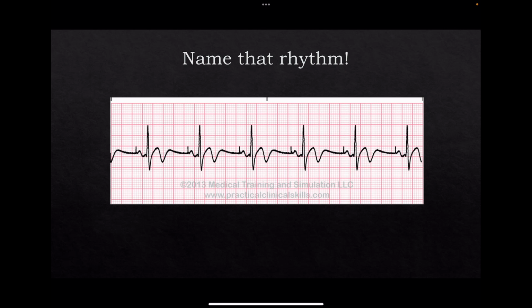You said it right, Caroline. Oh, okay. What is it? Third degree. No, you said it first, right the first time. Oh, you said it. Oh, this is an atrial paced rhythm. I'm sorry, I heard over here, I thought.